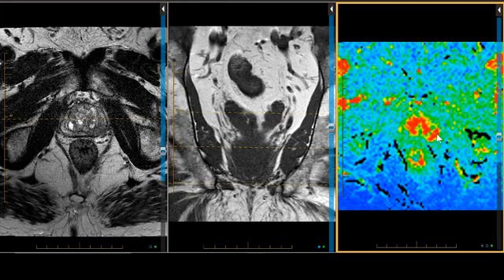I do rely on it in the breast. So I'm going to ignore the hue or shade of red because I don't think it's reliable. And all I'm doing is looking for hypervascularity in the PZ to see if that corroborates my tumor, but also helps me decide how vascular it is. For the more vascular it is earlier on, the more likely it is to be aggressive.